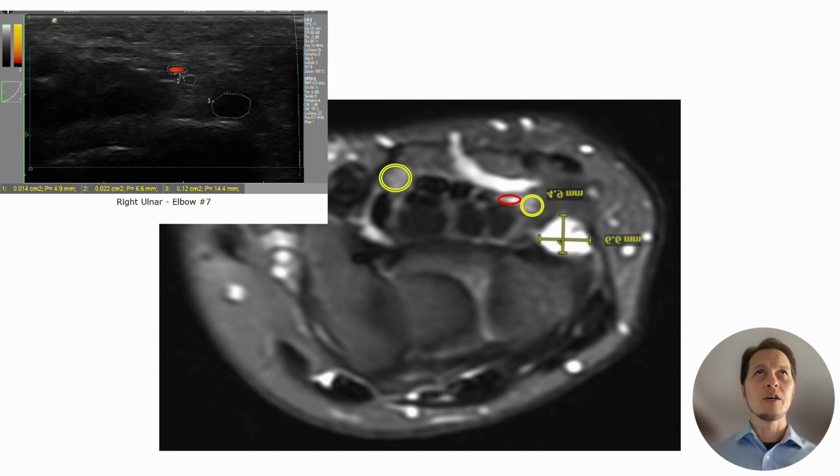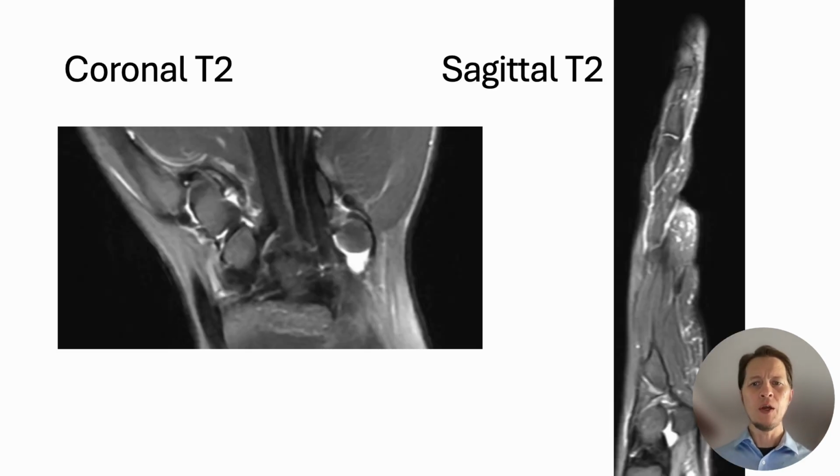So my conclusion to that was, yeah, maybe the hyperextension injury caused a joint issue, then eventually led to a ganglion and just some volar ulnar wrist symptoms that may have sort of given her a sense, so to speak, of paresthesias, but not true ulnar neuropathy at the wrist per se, based on the anatomical studies that we have here. But on top of that, we appear to have ulnar neuropathy at the elbow. Here are other pictures just to complete the case here in coronal and sagittal. And you can see on the sagittal image that white structure is right in between two bones, so that has all the characteristics of a ganglion coming from a joint.